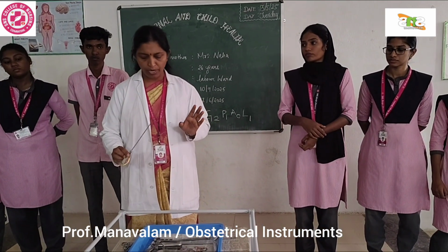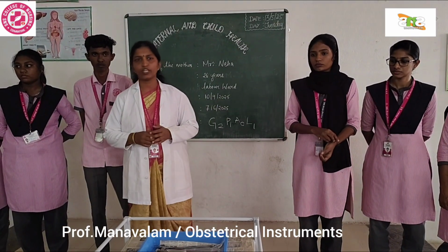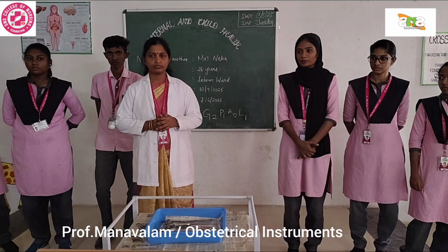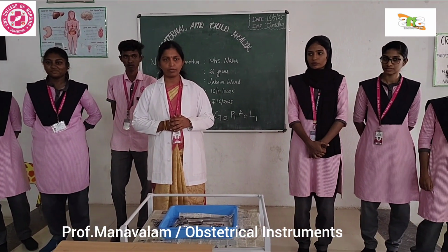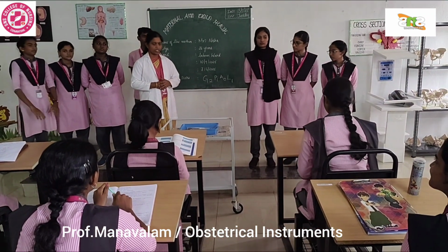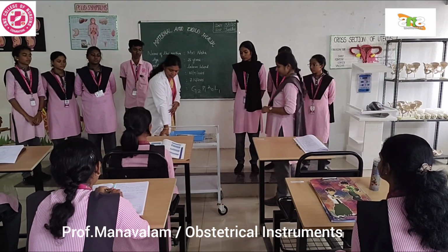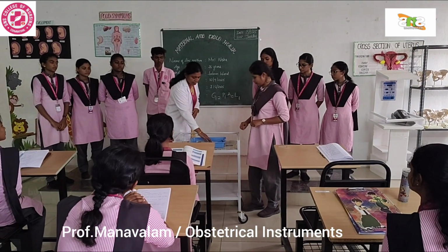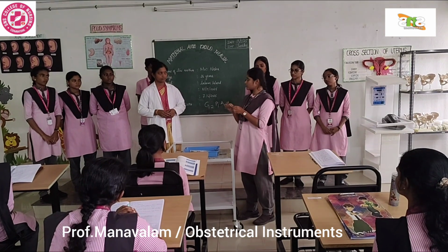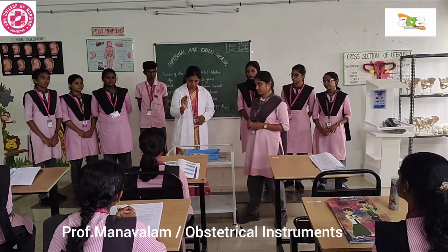Any one of you come forward, pick any one of these instruments and explain it. This is known as the umbilical cord cutter and it is used to cut the umbilical cord. Yes, very good.